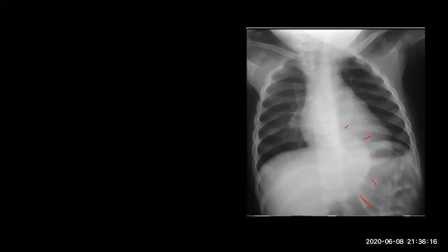Doctor, aortic aneurysm. Aortic aneurysm, but this is a child. You see, this is a child. Okay. Schwannoma. Extramedullary hematopoiesis. Okay, extramedullary hematopoiesis is usually bilateral. Okay. I will talk to you later. Doctor, schwannoma is also possible. Okay.